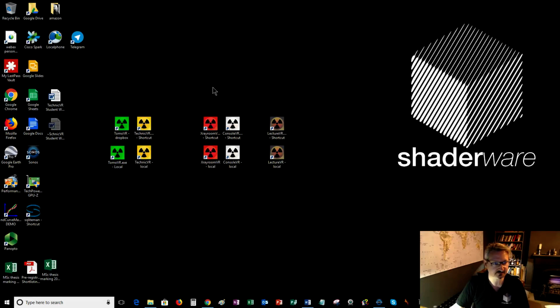And so TechnicVR is this program here. It's the yellow icon in the suite of programs. There's already a walkthrough for TomoVR and a walkthrough for Projection VR. So today I'm just going to be doing TechnicVR. So I'm going to run up TechnicVR by double-clicking on it.